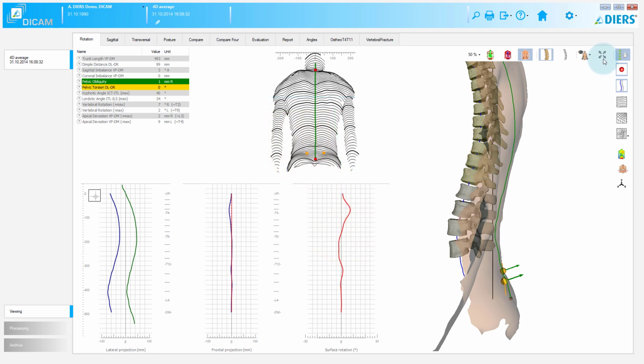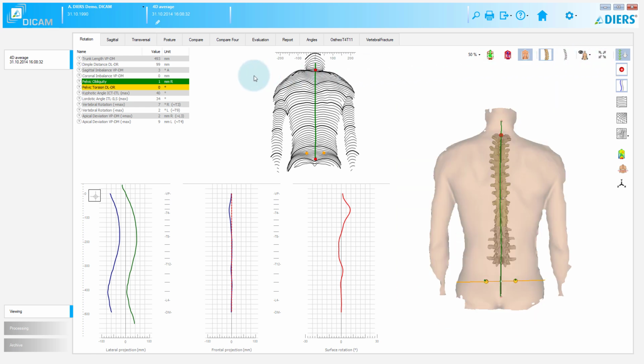Based on the studies known to date, there are only extremely narrow tolerance limits for pelvic torsion. Thus, a torsion of 3 to 4 degrees can already represent something to take a closer clinical look at. In any case, the development of a pelvic torsion during the previously described simulation of the shortening compensation must be considered. No matter how other parameters develop in this process, a worsening of pelvic torsion is rarely an acceptable reaction.